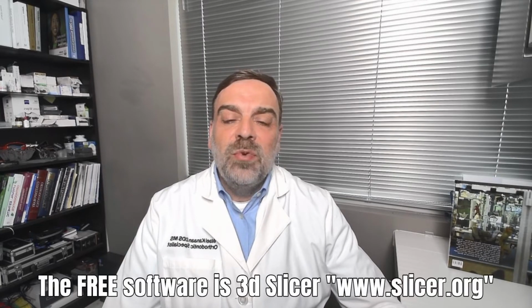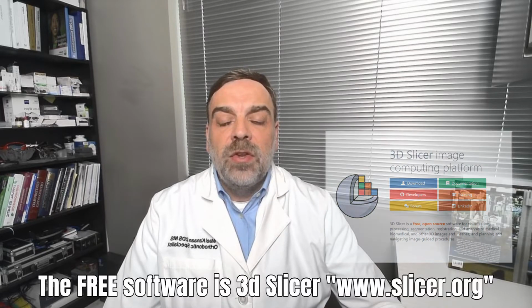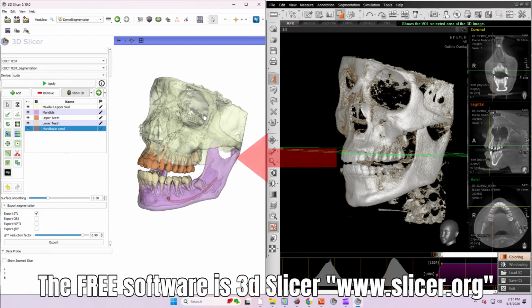Hello everyone, this is Dr. Kanaan, and today I will show you how to use a free software service that is available to everyone, how to use it with your CBCT and to transfer the CBCT from something like this into something like this.